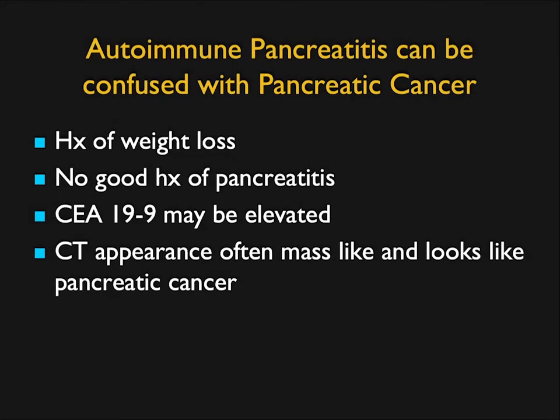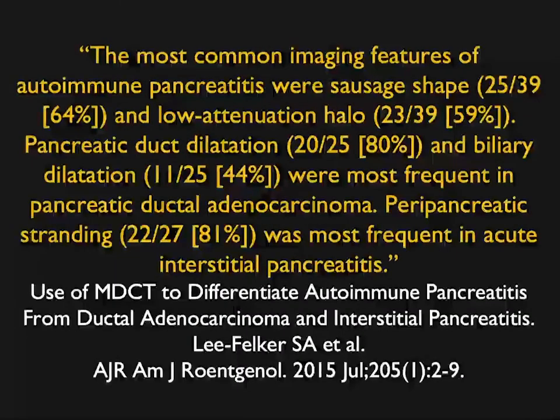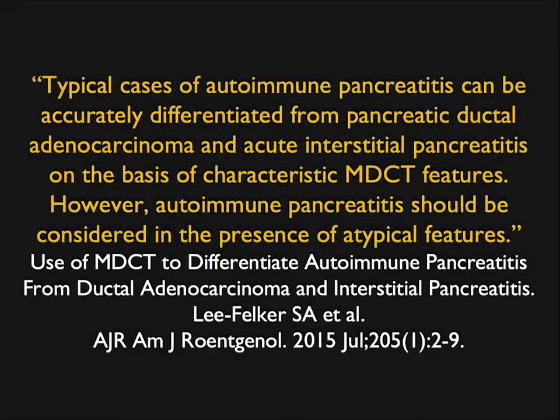But again, without that, if it's only the pancreas, unless you think about it. Now remember, if you think it's autoimmune pancreatitis, just get an IgG4. Most of the time it's going to be positive. So again, really very, very important. Sometimes it's classic, this sausage-shaped configuration or this halo around the lesion becomes very classic. But sometimes it's just not easy.